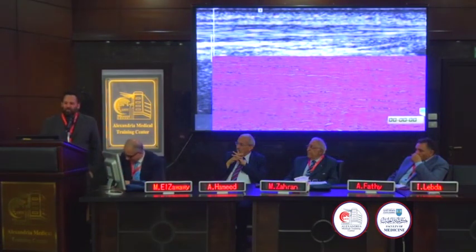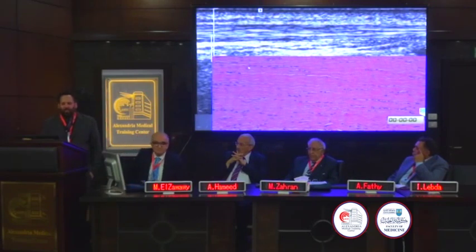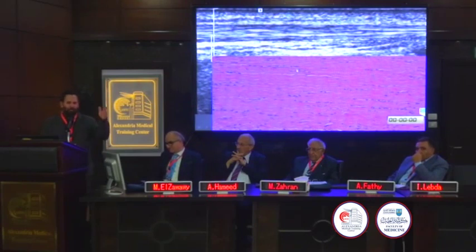Okay, again, although it looks longitudinal on ultrasound, you see the undulation. Now, remember, we had a higher power view that showed you that each of these tenocytes are different. This low power view shows you that they're oriented in columns, right? One after the other, after the other.